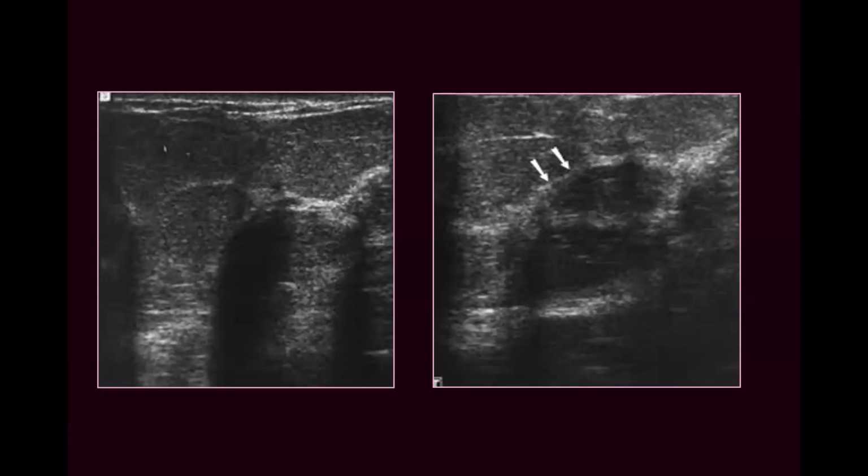What does this image represent? Could you imagine what is going on in these two images and what is the difference between the two? Any volunteer?